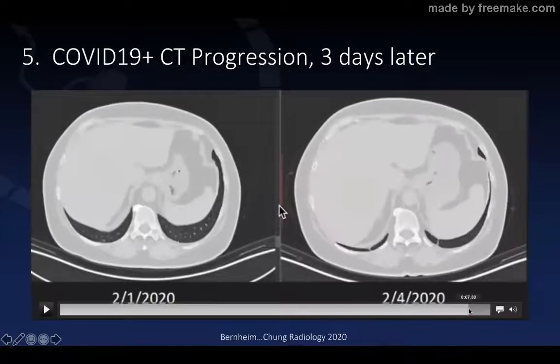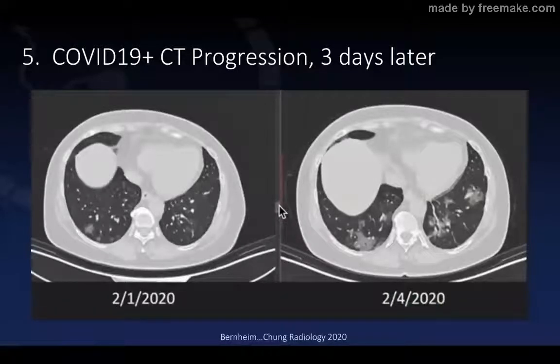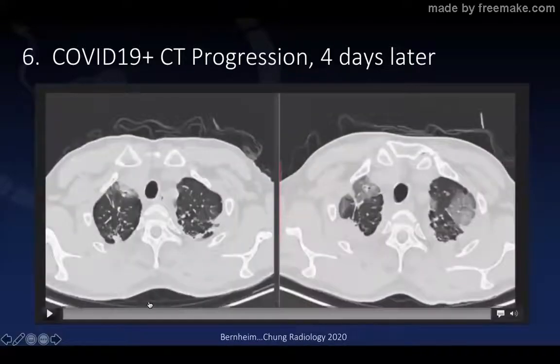Fairly recent papers now emerging, tracking the course of disease, seem to show that the peak of opacities of lung findings are centered around 10 days. And so depending on the duration of symptoms, it's not surprising to see relatively milder, smaller areas of distribution becoming more confluent and larger over time. Okay, here's another patient here.